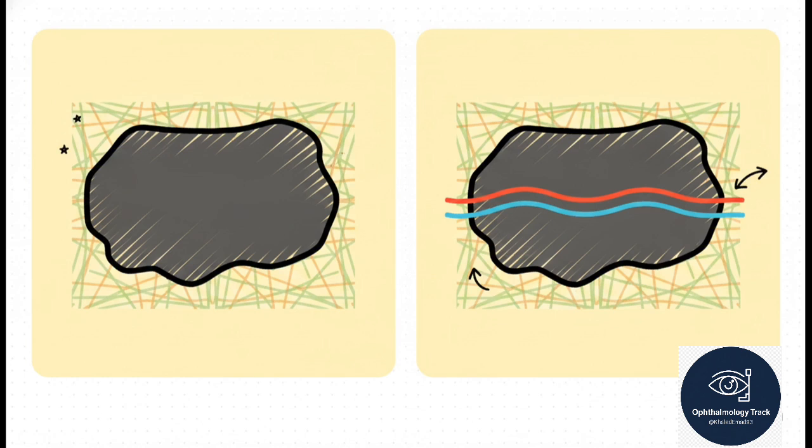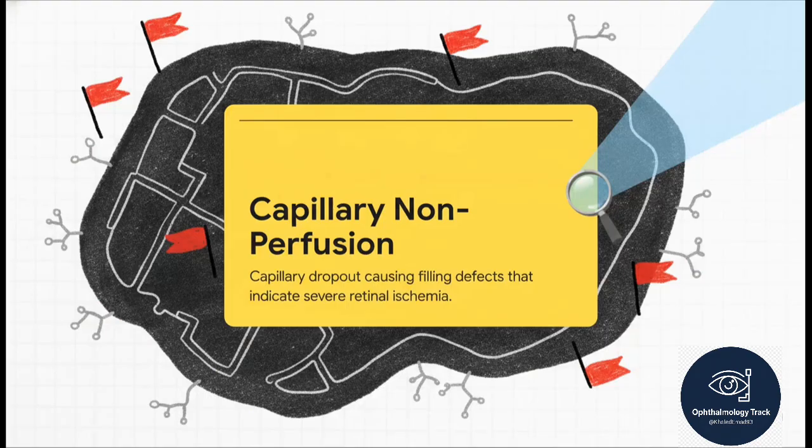But look at a subretinal hemorrhage. Because it's located underneath the retina, it only blocks the choroidal fluorescence. If you look really closely at an angiogram of this, you'll actually see glowing retinal blood vessels passing seamlessly right over that dark, blocked area. Seeing that vessel literally cross over the dark patch instantly gives you the 3D depth you need to confidently diagnose it as subretinal.